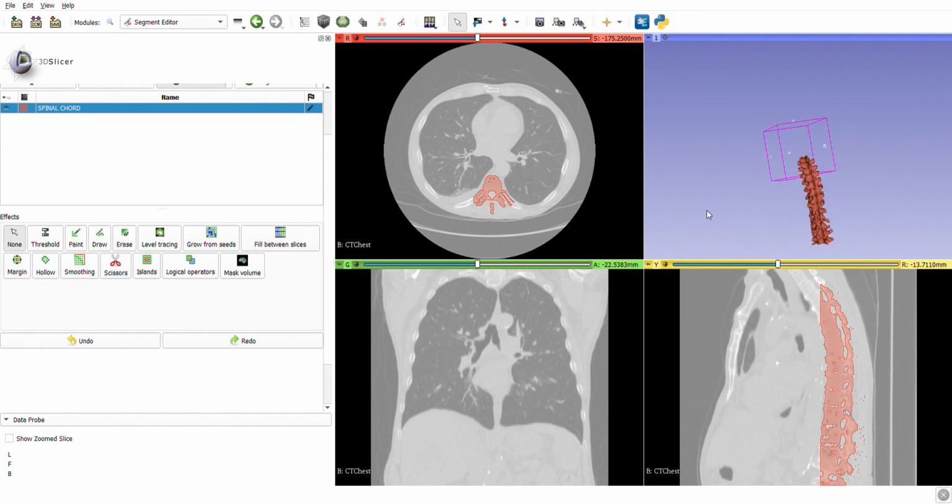In order to 3D print this, whatever 3D model I have created over here, I need to get the STL file format, because for 3D printing the file format required is your STL, that is standard triangle language. So how to get that?